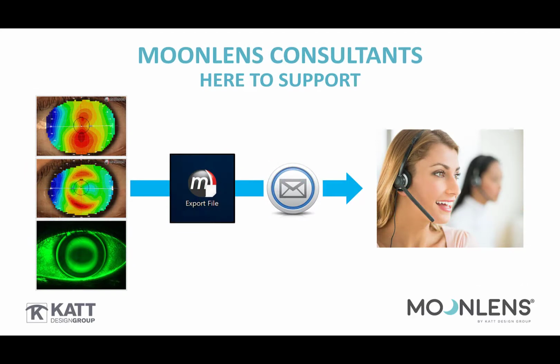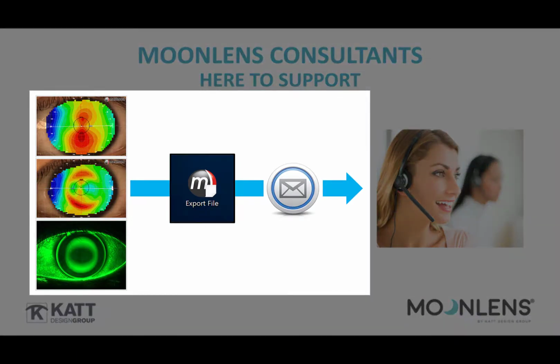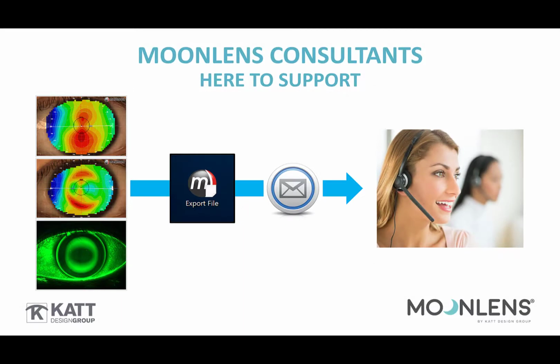One helpful and relieving consideration is your MoonLens distributor is here to support you through this process. The initial cases can be reviewed with your consultant to ensure the optimal outcome is achieved for your MoonLens patients. Export the digital topography files and any slit lamp images so your MoonLens consultant has the full picture. Together, you will quickly learn what to look for and how to assess the findings.